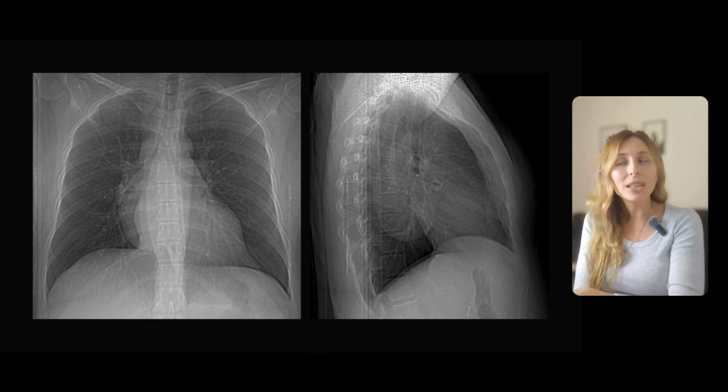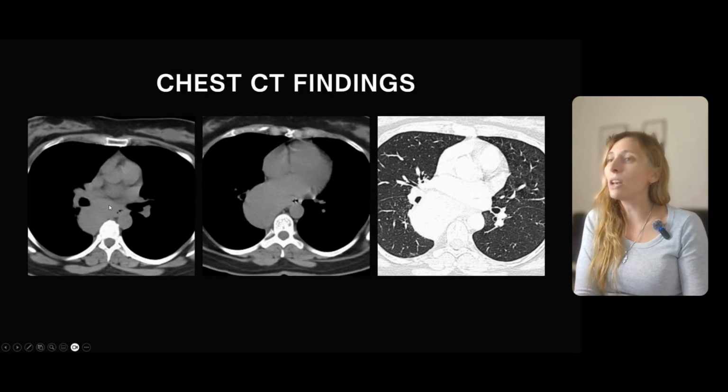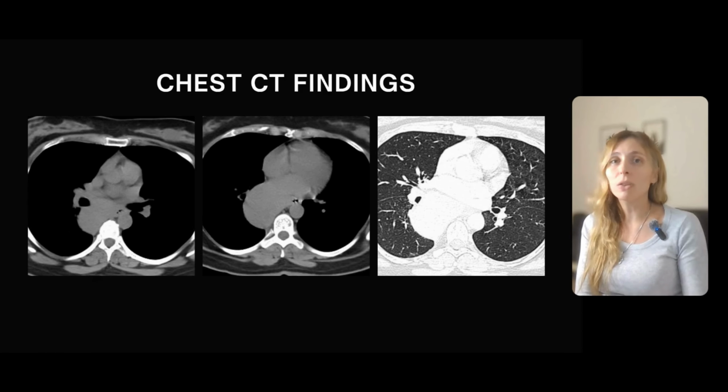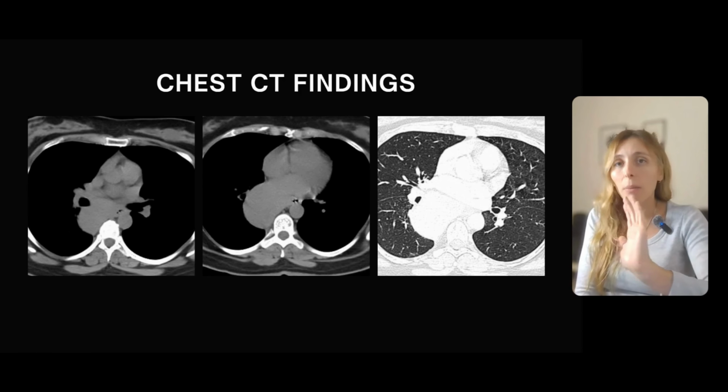As you can imagine, we did a chest CT with intravenous contrast. This is the non-contrast acquisition, and you can see that this in fact looks like a solid homogeneous focal lesion in the posterior mediastinum in a right paravertebral location, and the relationship with the lung parenchyma is one of the key findings here, because what we were talking about, this perfect border, shows us that the lesion is compressing the lung parenchyma, not infiltrating the lung parenchyma.